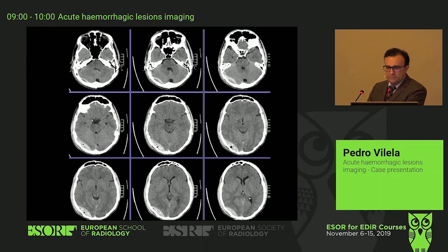The fourth ventricle is asymmetrical, and as it goes into the posterior fossa, it is even more likely to cause bigger compression of structures and intracranial hypertension. So, very good. Everything was said. So, if we have an infratentorial and supratentorial haemorrhagic extraaxial lesion, it has to be epidural.